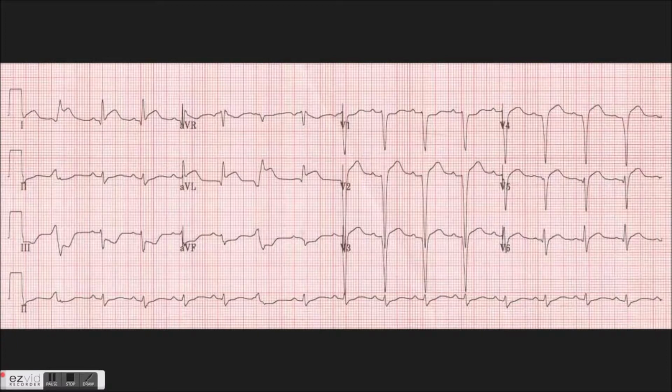All right, so what should have jumped out at you? Lead 1 and AVL. So the morphology changes from beat to beat, the ST elevation does, and there could be all kinds of things going wrong. But what you're looking at is a lateral MI. So we see the elevation in 1 and AVL, we move down to 2, 3 and AVF. We have reciprocal depression for sure in 3 and AVF.